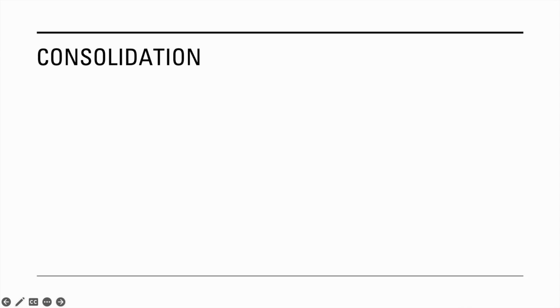Hello and welcome. Today, in this video, I am going to talk about imaging in lung consolidation. At the end of this video, you will understand the basic imaging findings in lung consolidation and their implications in making a diagnosis.